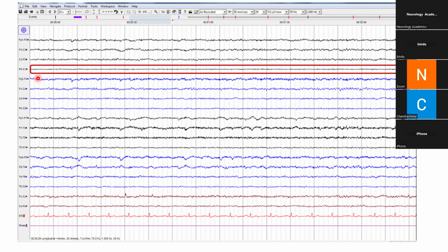If you ask whether the whole EEG is not normal, because there is relatively low voltage activity seen throughout the record, that may be due to 101 reasons. But just to introduce the term, this is what a salt bridge is.